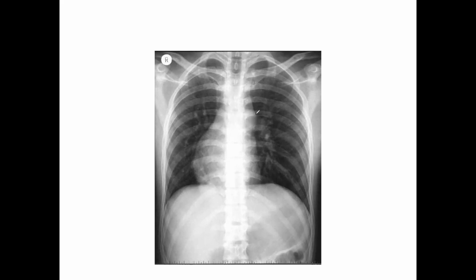One thing that I didn't mention on the last x-ray that we wanted to look at is where the airway and blood vessels enter into the lung. That's going to be called your hilum or hilar region. So you want to make sure that you pay attention to that. You can see the gastric air bubble down underneath the diaphragm here. So that's good costophrenic angles, good aerated lung tissue.